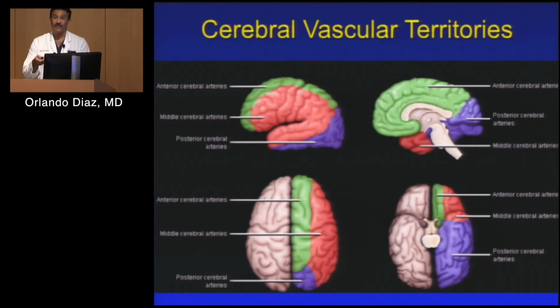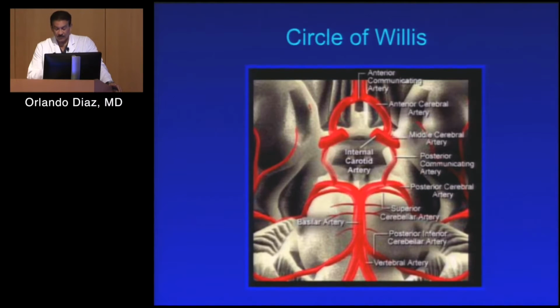So we need to start educating people, educating the patient, the family, the emergency doctor. Believe it or not, sometimes there are delays in transferring the patient from hospital to hospital because they don't know the implication of sending the patient on time to fix the problem. Of course, there is also a connection inside the brain. So this is the basilar, this is the posterior cerebral, this is the internal carotid, and they are connected, the circle of Willis.